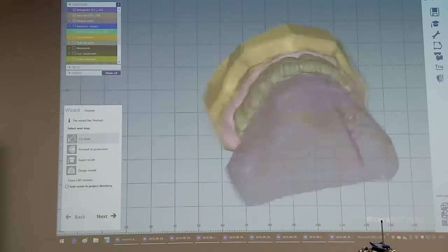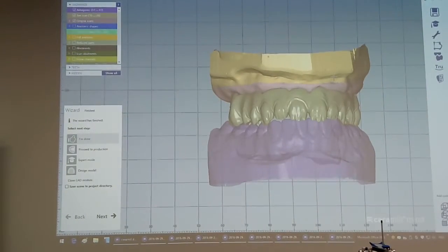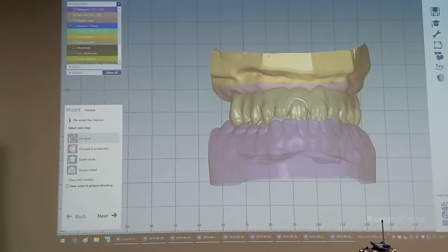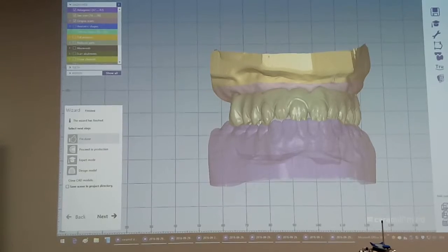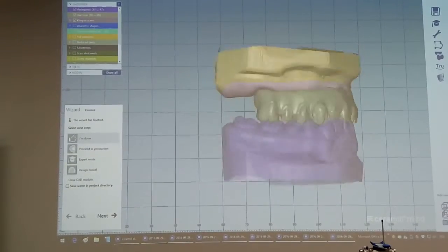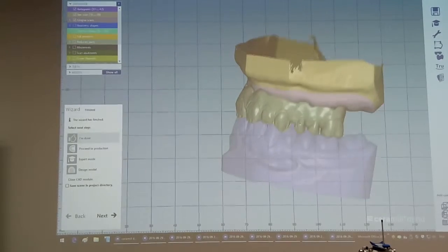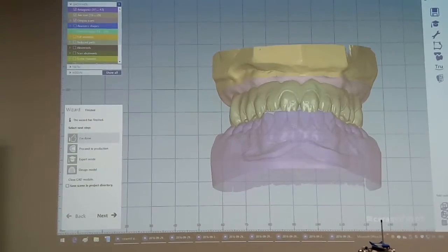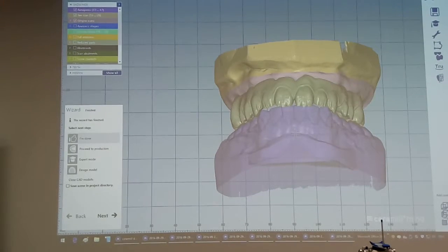And this is made out of either the choice zirconia or solid. So this is the result after our construction. The question is now how we get this construction, this result.